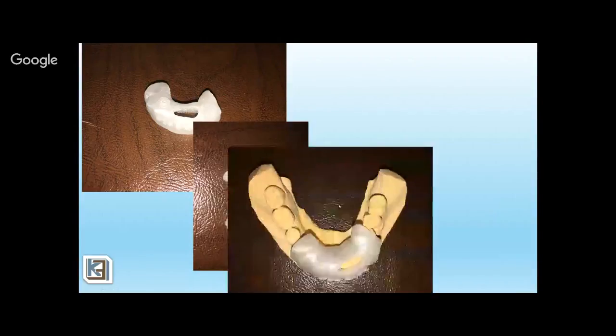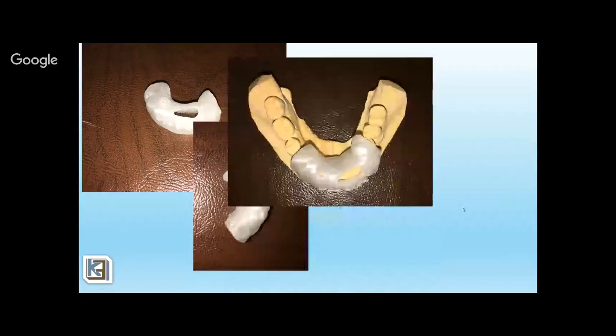This was my very first case, done about 3 years ago, and I used the Robox. I'm not sure if a lot of you have had the chance to work with it. It's an FDM printer. I printed with Dr. Rick Ferguson's profile for surgical guides. Its accuracy is at best 100 microns, and so that was my very first created guide for Endo Access. Again, this is one guide hole tube there, no metal sleeve as a limitation, and these are different views as it fits on top of the model.